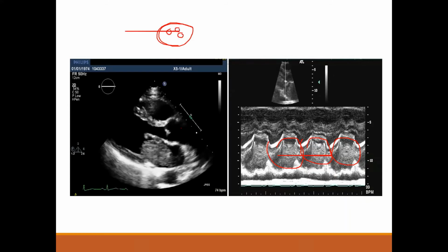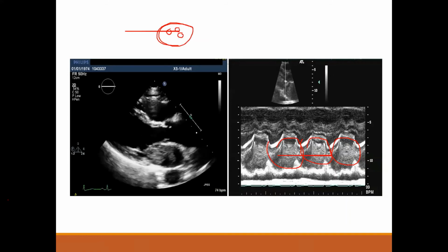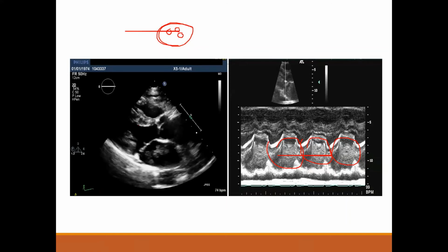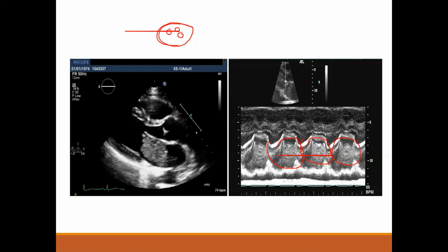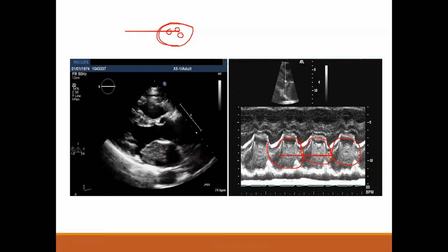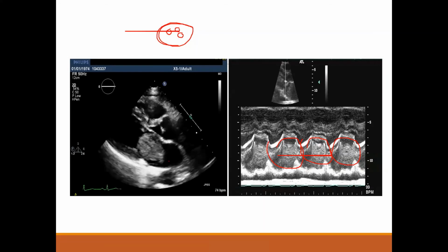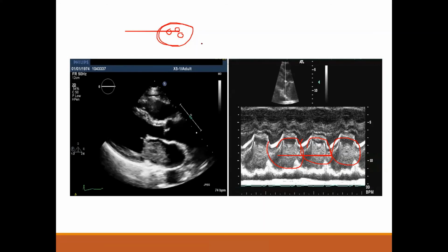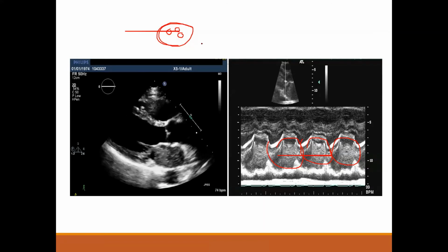You don't have to say there is liquefaction, because liquefaction is a histopathology diagnosis. But in echo we say we find echolucent spots or echodense spots. By echodense we mean calcification, and by echolucence we suggest liquefaction. But we have to stick to the echo jargon, not the histopathology, because we don't know exactly.